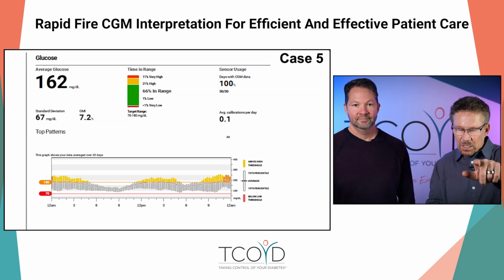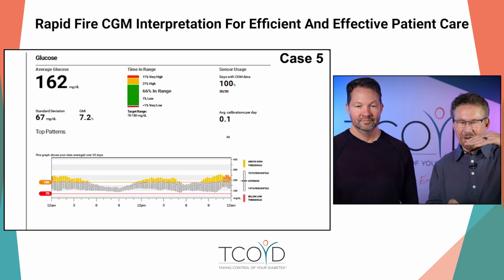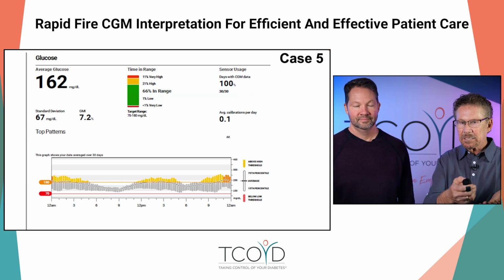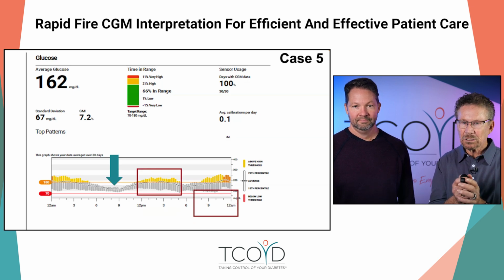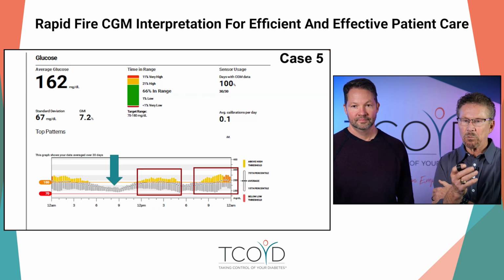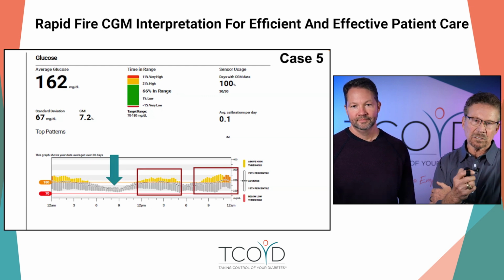But you can see that in the early morning, I can't remember what this patient's on, but the hybrid closed loop, you can see that standard deviation, those bars are narrow. So it's probably like 20 there, and he gets high after eating. So I'm pointing out that he's doing great there, and then goes up after lunch, after dinner, and whenever you see someone continue to go to bed above 180, 200, you've got to talk about snacking. And who doesn't snack at night?